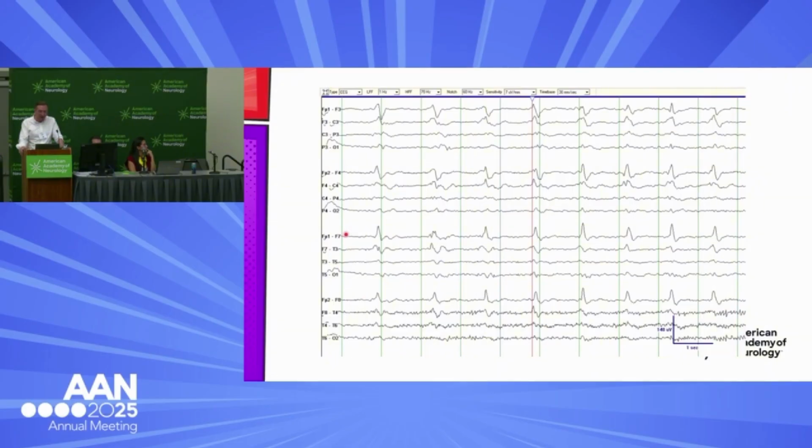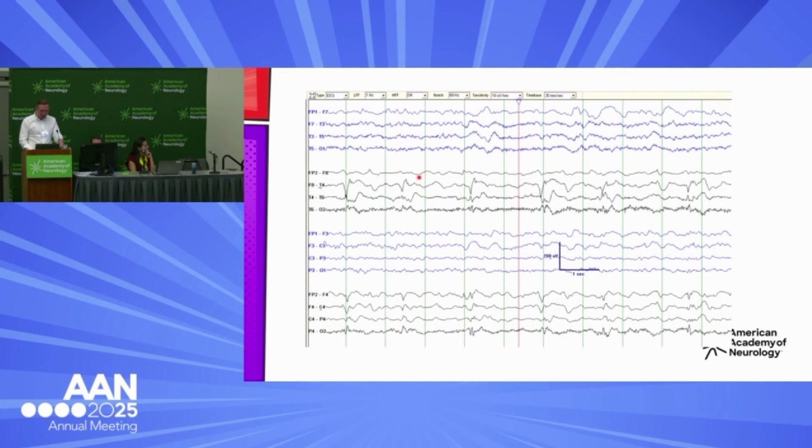So here's an example. See, one of my fellows here, he better know this answer. What are these generalized periodic discharges? So in both hemispheres, synchronously, there's an inter-discharge interval. So what about this one? So this is left temporal, left parasagittal, right parasagittal. So it's only in one hemisphere, it's in the right hemisphere. You have these rather periodic discharges. So this would be lateralized periodic discharges.